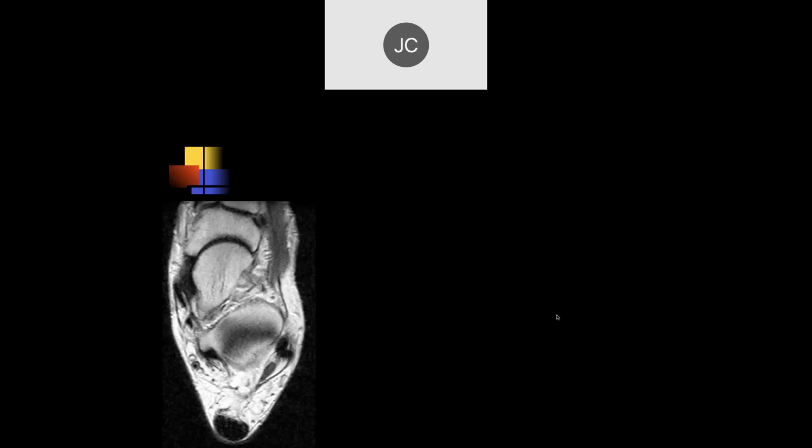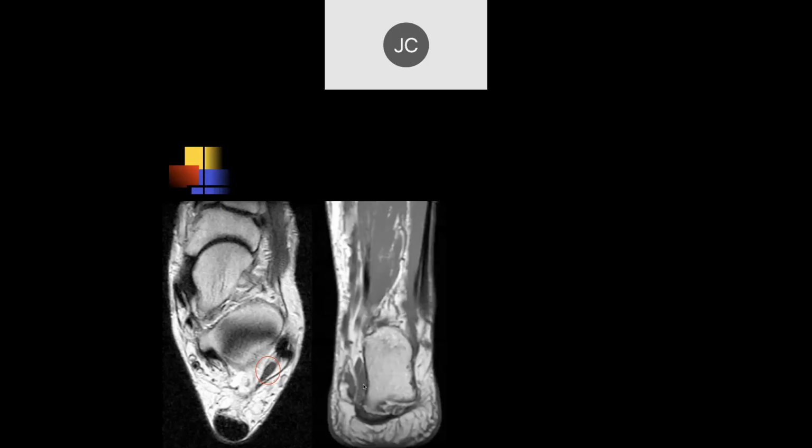Okay, Elior. Okay, so here, I think we're going to look behind the peroneal tendons. So here's the peroneal, and what is this? That's the peroneal retinaculum. Good, that's the peroneal retinaculum, peroneal tendons, and then we have this funny structure right there, which is coming down and attaching to the lateral aspect of the calcaneus, which I thought we were still on with the last one.